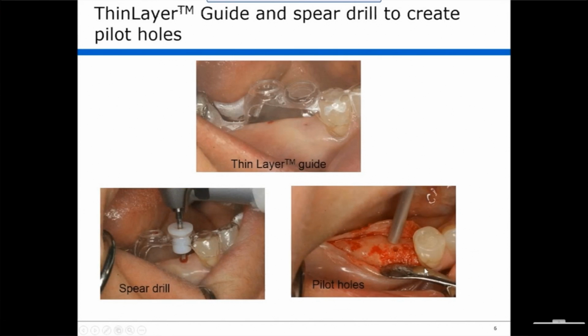Here's your bleeding point. So the implant trajectory, instead of being defined by the top and the bottom of the tube, is defined by the guide hole here, which is exactly the same position and height as the top of the metal tube that you saw, and this bleeding point.